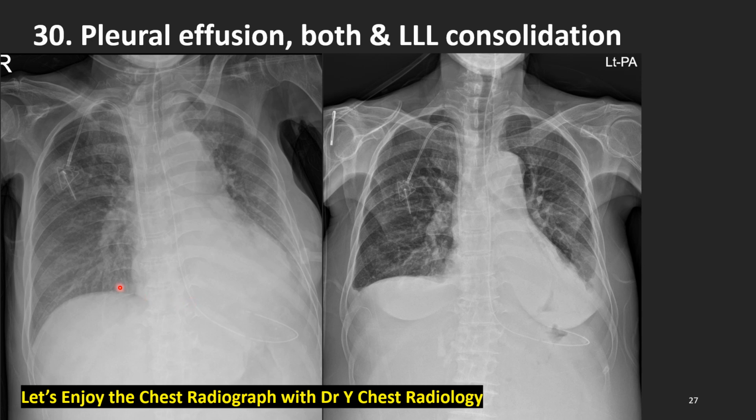We are now confident that this right side diffuse haziness is from pleural effusion, not from lung. Let's go to the left lower lobe.